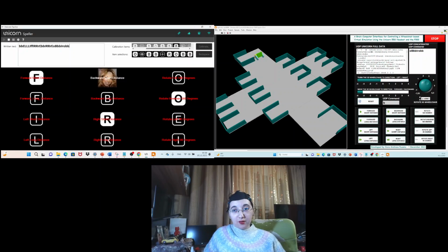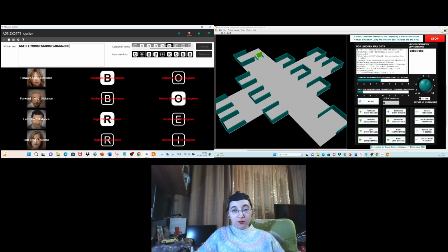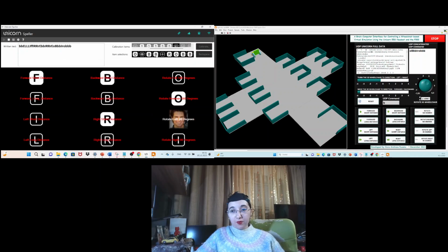Let's see. Perfect. Okay. Everything's worked fine.